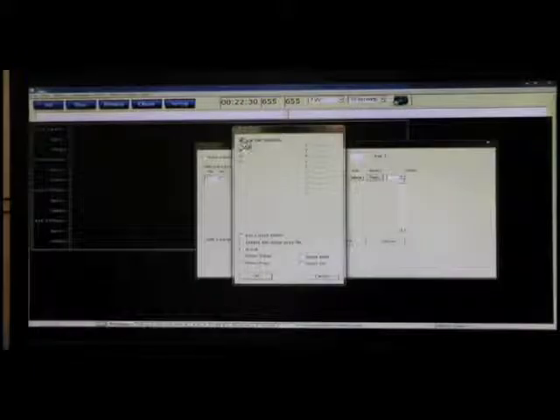I'm now going to bring up my menu. And when I bring up my menu, as you can see, you have a lot of different options. The first one that's always checked is Use Tab Defaults. Maybe we want to make this a little bit more personalized, and we are. I'm only going to focus on the C3 channel right now, which is C3 to A1. So I'm going to uncheck that I display that, uncheck that I display that, and uncheck that I display that.